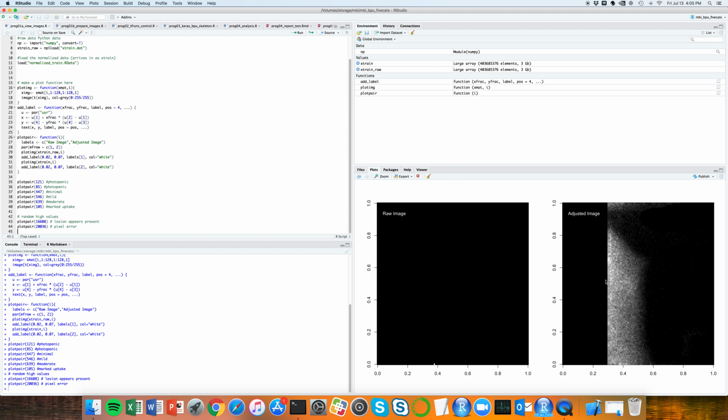One thing we noticed going in, you'll see a lot of pictures of BPU in the literature. The images look lovely. Some of these, when I view them, we get a single bright pixel. It's believed to be just an artifact within the DICOM file. What my leveling does is limit this so that the scaled image then works on a more reasonable grayscale structure. And that improved training a reasonable amount.